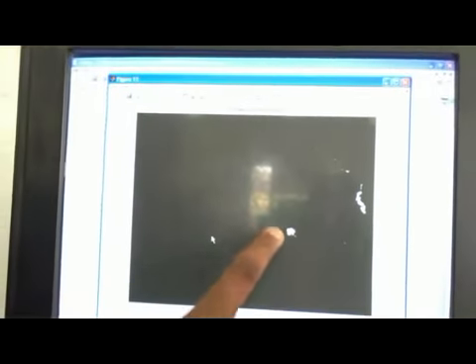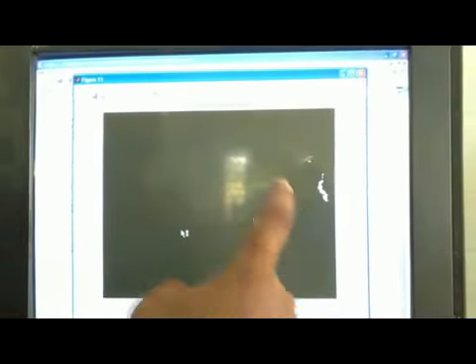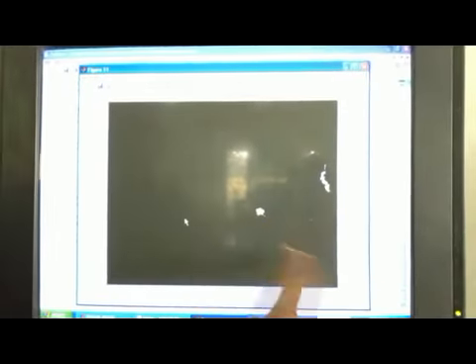These are the exudates which ought to be photocoagulated using a laser in order to treat the disease called diabetic retinopathy. We have just calculated the area, which is 845 pixels.